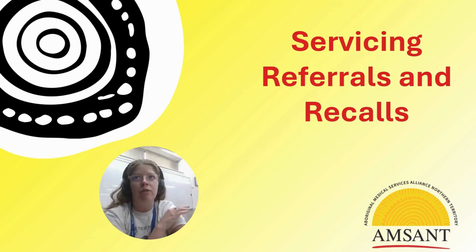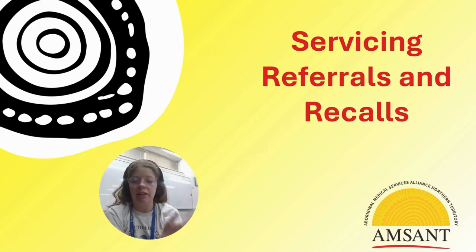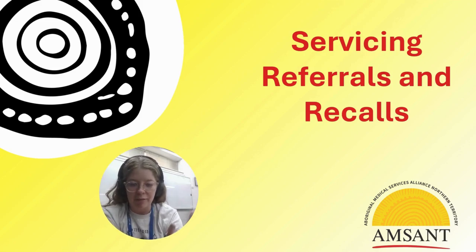A recall is for when someone has already had an audiology service, so normally this will be set by an audiologist themselves, and it's really the review time. So we might be looking at an annual review to monitor for family history of hearing loss, or a 3-month review if there's presence of middle ear disease.